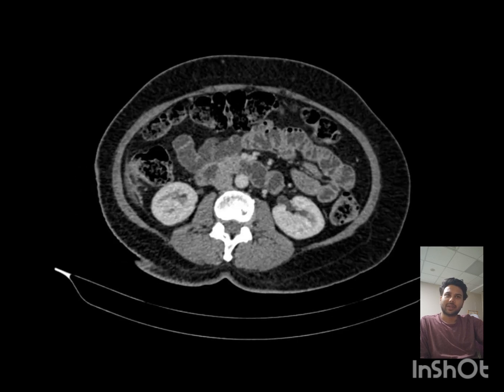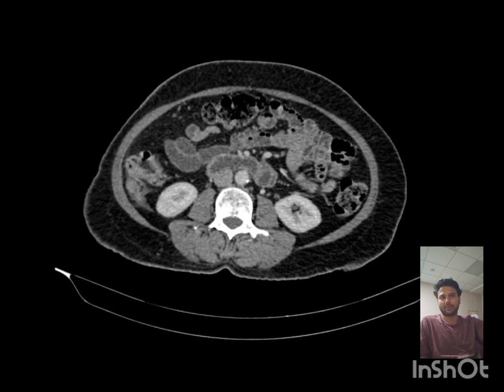So this patient came with a complaint of right lower abdominal pain since 1 day, with a history of very acute right lower abdominal pain. You would think appendicitis. So this patient went to a clinician, who then referred to a radiologist, who did an ultrasound scan of the abdomen, and on ultrasound the right lower abdomen did not show any inflamed appendix at all.